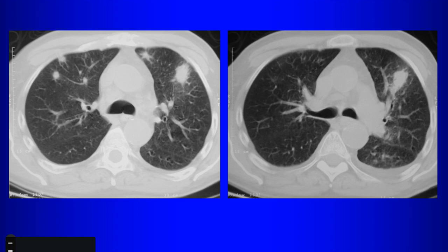Well, we did discuss, we talked about a certain kind of lung cancer, right? That can be associated with, what is that? The ground glass, like, mucinous tumors or adenocarcinomas can also be associated with ground glass in the periphery, so maybe you have something like that. Ground glass in the periphery can also indicate hemorrhage, right?